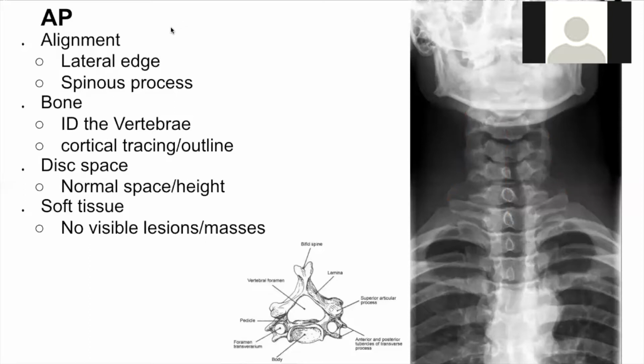Next, we're going to identify the bony structures here. I identify T1. That way it lets me know where C7 and everything else is. So T1 is right here. The reason I know that this is T1 is because the lateral transverse processes are pointing superiorly, and the first rib is coming off T1.